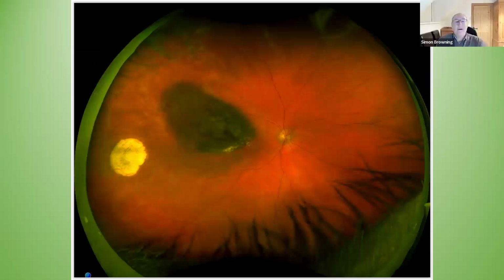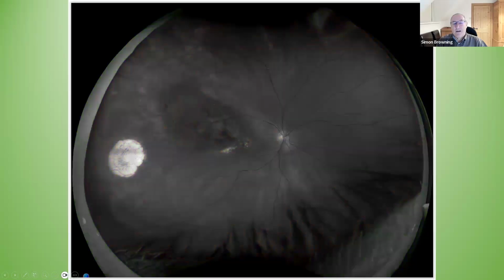And this is the one I used on my front slide. You're beginning to see hemorrhaging here as well. This is just another large window defect. But I think, again, the thing to look for with melanomas, remember I said about those lovely distinct margins you see on dormant lesions? This just looks odd. It's the wrong shape. It's ill-defined. There is your clue. You can see it on all levels of the retina.